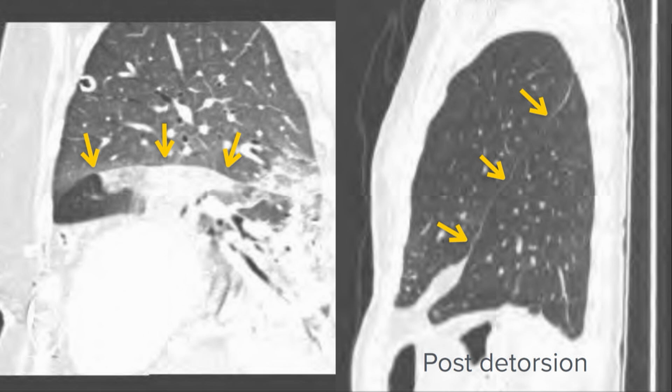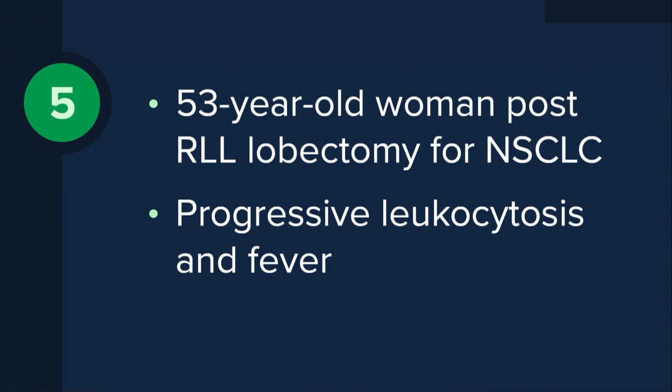In this case, they actually did document that they thought it was torsed. They detorsed it. The literature says detorsed, but you don't find that in the dictionary. But post-detorsion, this is what it looked like. And so the orientation of that major fissure was, again, anatomic, and the opacities and the lung abnormalities had resolved. Fortunately, they didn't lose any portion of that transplanted lung.